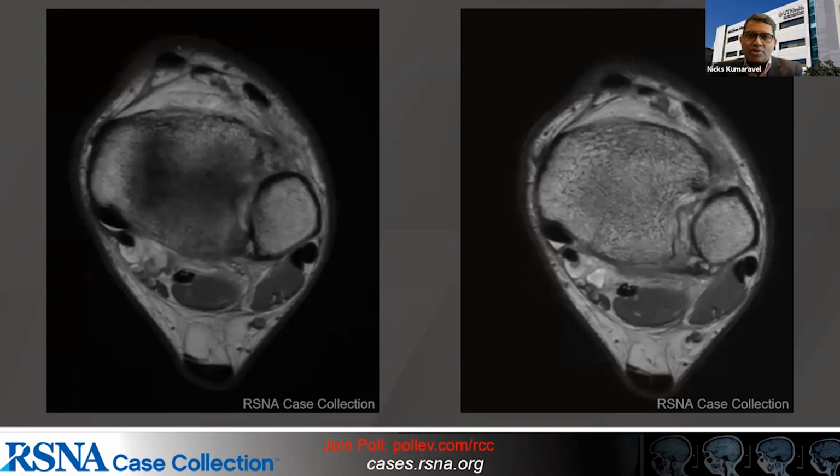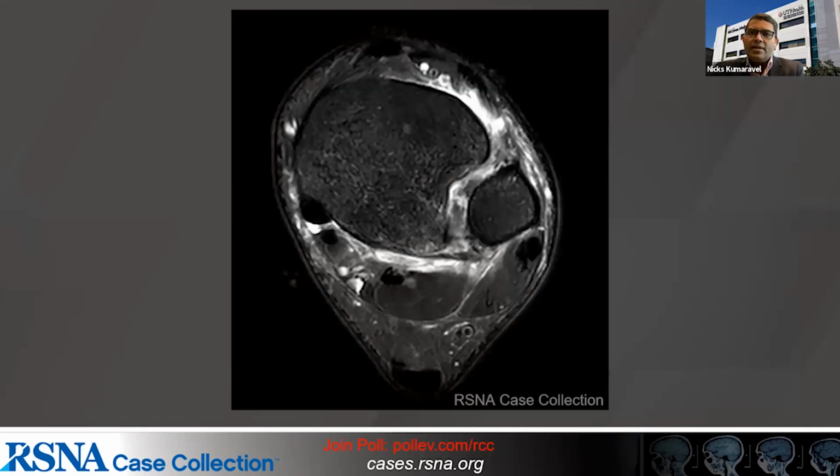And again, a couple more images, this time highlighting the level where you think could be the reason for the pathology. Please do pay some attention towards the ligamentous components of it and think about what could be the cause for this patient's pain. Again, the T2 weighted non-fat saturated images is what we've got here. Next one again, please. And here is the more fat saturated image, drawing your attention to what could be the potential reason why this patient's got pain.